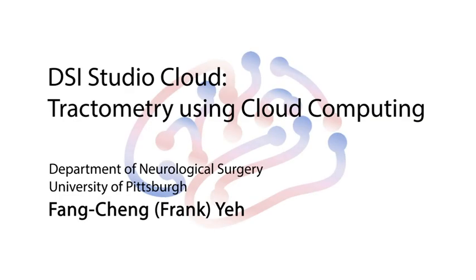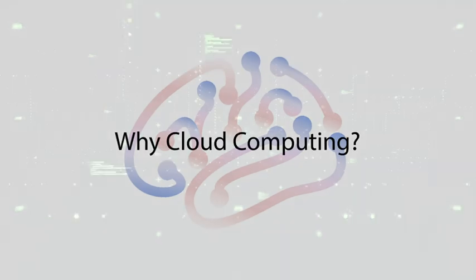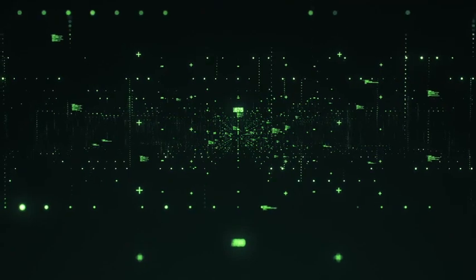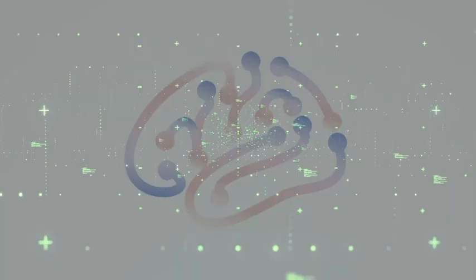In this video, I am going to introduce DSI Studio Cloud, a cloud computing environment for tractography analysis. Before I show how to use it, you may wonder, why do we need cloud computing and what are the benefits? Here are some points.